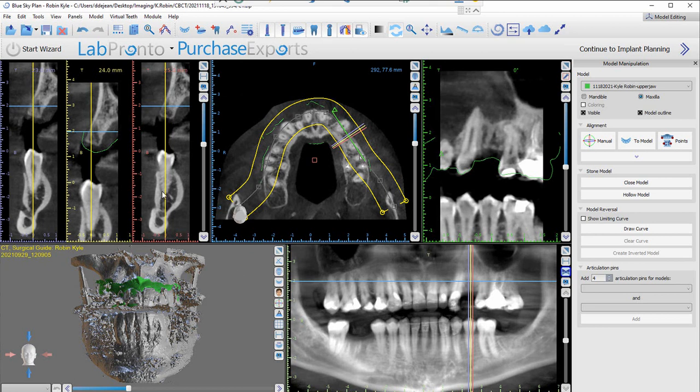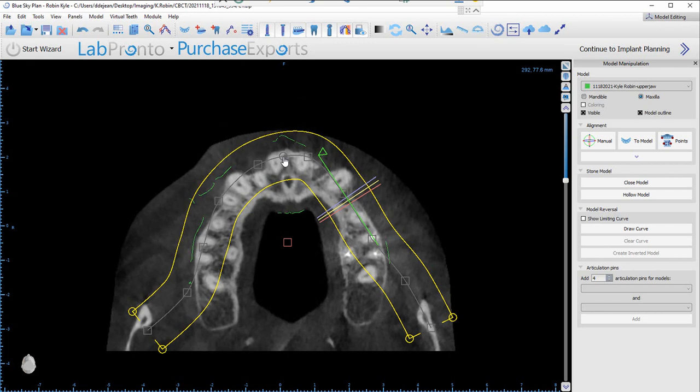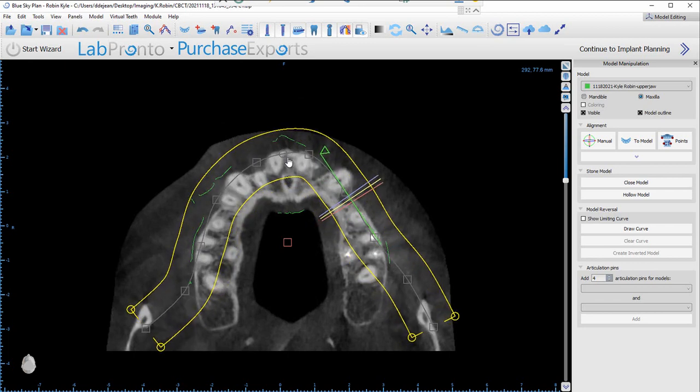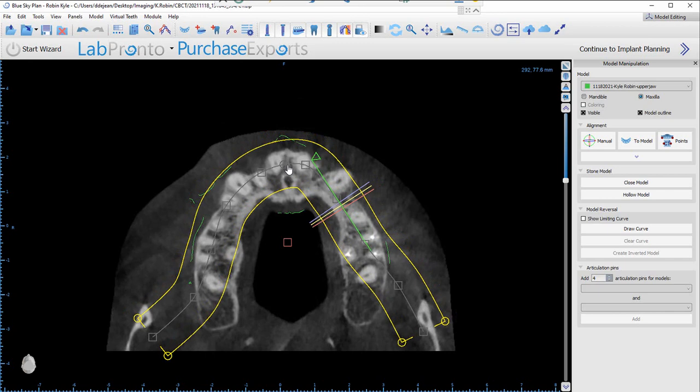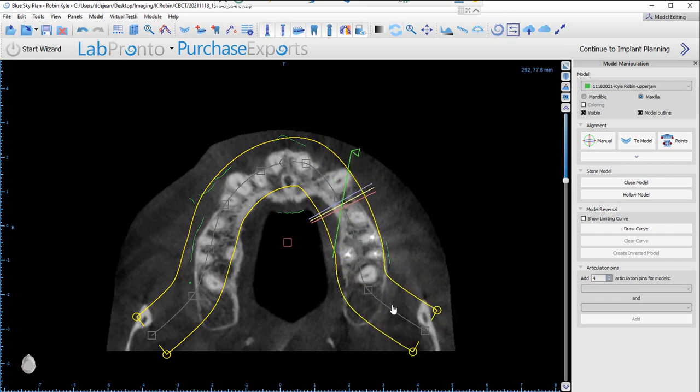All right, so once you have the maxilla stitched with the DICOM data, see this little middle part right here? I'm going to zoom in. See the little middle part? That'll move all those data coordinates right now. So right now it's shaped for your mandible. You got to bring this in to get it for the maxilla. So you get it about mid area and then just start moving these points and this will alter the panorex.